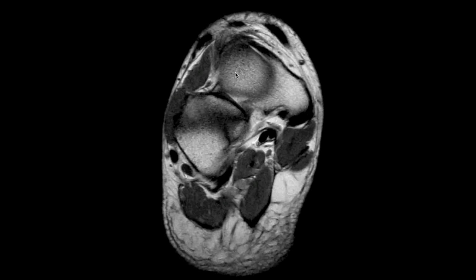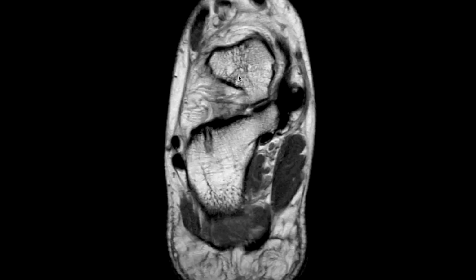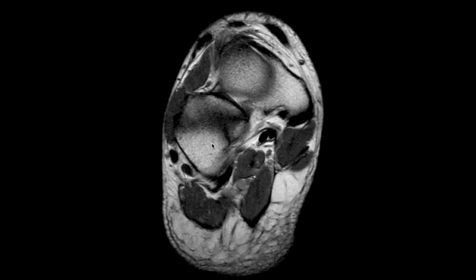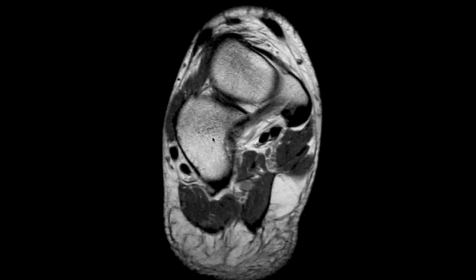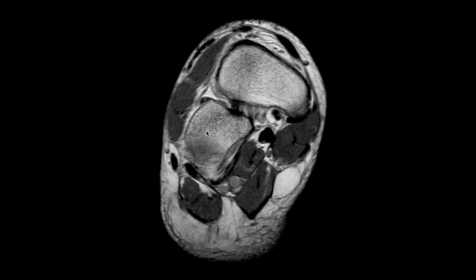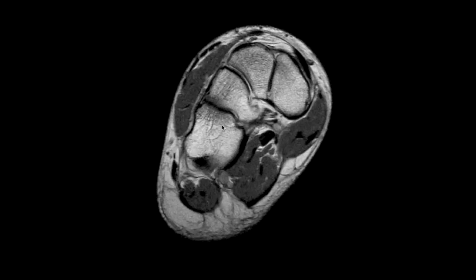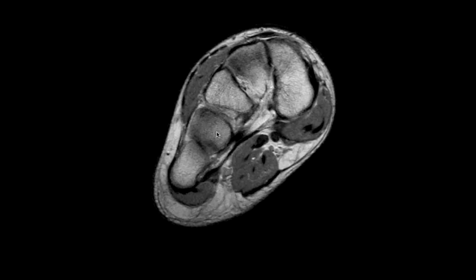So this is the talar head and neck. This is the navicular. We went from the body of the calcaneus into the anterior process and finally into the cuboid. And as we extend more distally, we see that keystone configuration, this Roman arch configuration, the cuneiforms, first, second, third cuneiform, cuboid, and then we get to the level of the bases of the metatarsals.